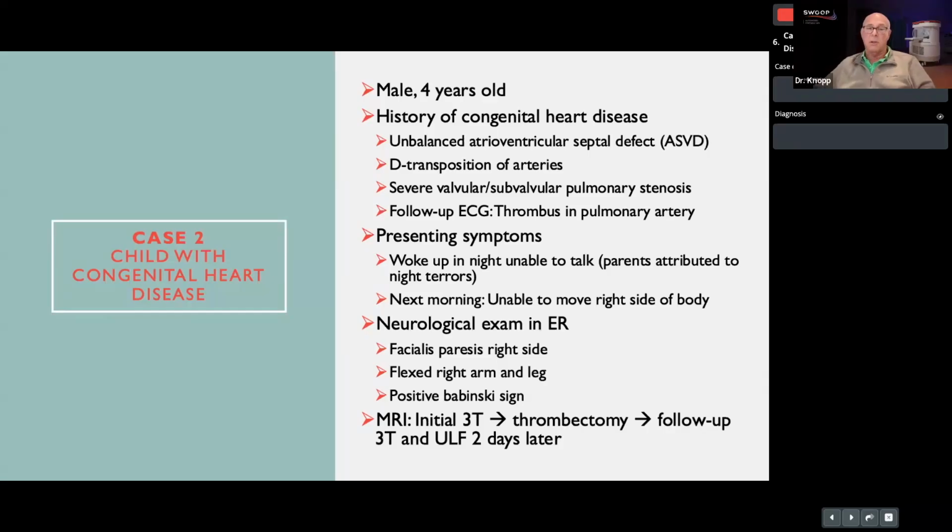Okay, so let's look at the imaging. Just even before doing that, from a radiology standpoint, what's critical to us and to me is getting appropriate clinical information. It focuses what I'm thinking about before even looking at the images. Clearly, this is pointing to acute ischemic infarct, right-sided physical exam, left-sided brain. So let's take a look and let's see what the Swoop is showing us.